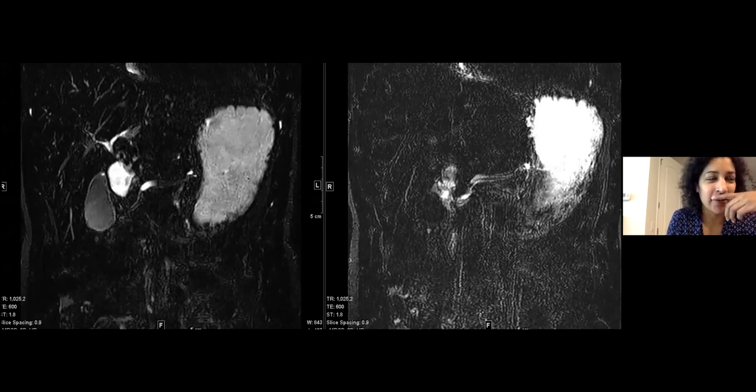Right. And we hypothesized that, because the visceral fat has more metabolic activity, for some reason it was not getting edematous. Maybe it was, I don't know, working on other stuff or something, but on MRI it looked really weird because it was all fluid in the subcutaneous tissues and completely normal fat in the visceral fat.